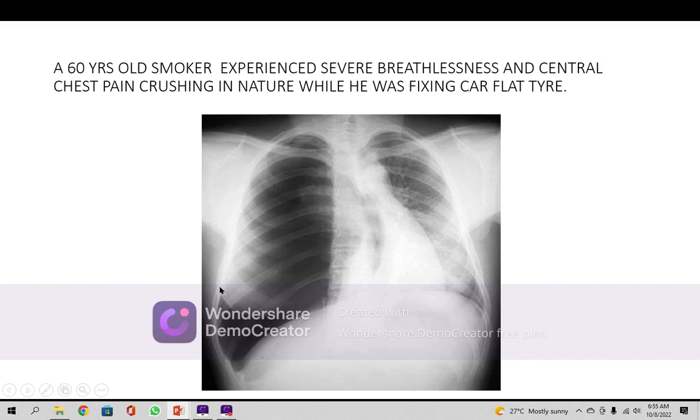The other investigation could be done with the lateral view and should be done with the HRCT. It should be done etiologically, sputum for AFB and GeneXpert, etc., DR. And other routine investigations should be done with it, because the heart is actually compromised here. So do it as quickly as possible. The air should be out by any means, by hook or by crook.